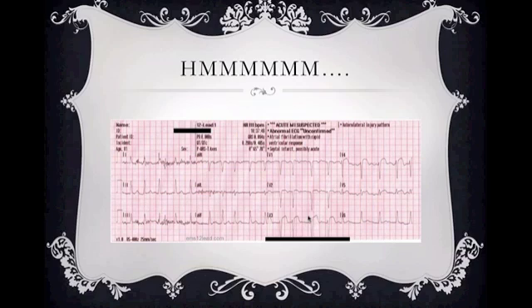All right. So this is diagnosing as an anterior wall MI, but we're looking at this. Deep Q waves, some ST segment elevation, that T to QRS ratio is very low. We're looking at about 0.09 to 0.10. Remember, that criteria only needs to be in one lead. This patient's probably having a ventricular aneurysm.